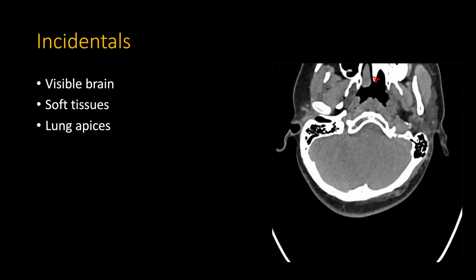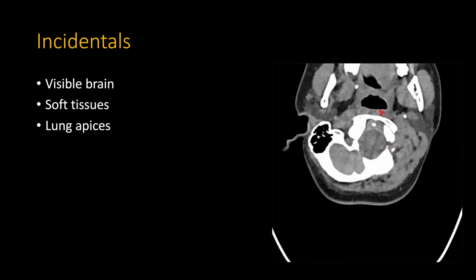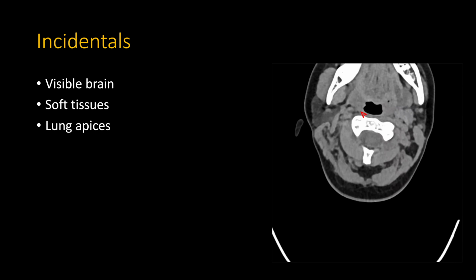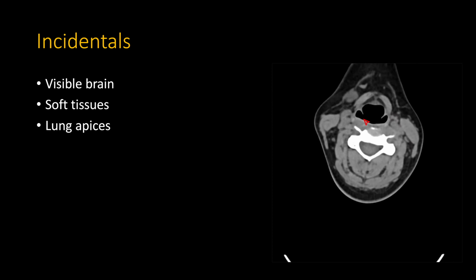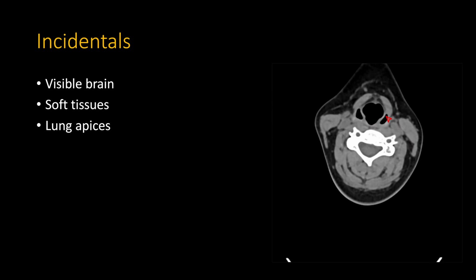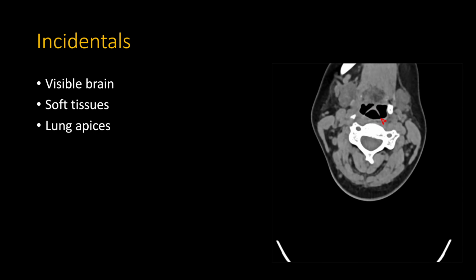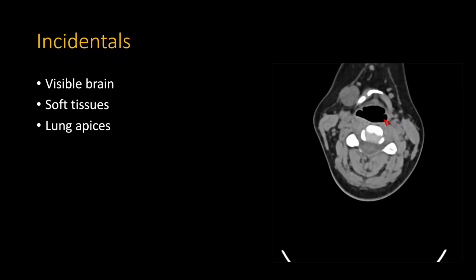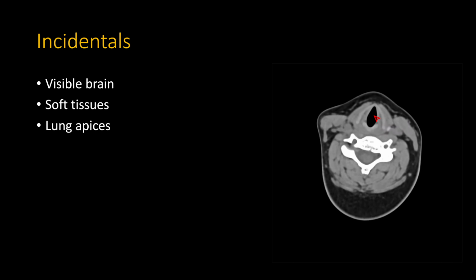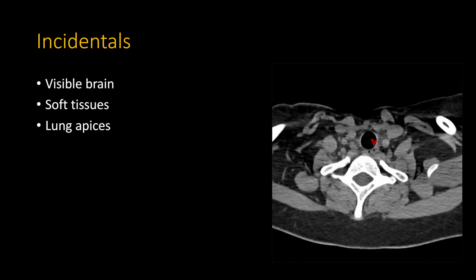Then I come back down one more time while looking at the pharynx and larynx. So you start up here at your nasopharynx, make sure there's no asymmetry or mass, come down your oropharynx, and then you come down. You're going to have your supraglottic larynx, your hypopharynx here. Make sure there's no asymmetry, no asymmetric effacement of any of those recesses, like your piriform sinuses or vallecula in the setting of the oropharynx. Here are the vallecula, here are the piriform sinuses. Then you look at the larynx, make sure again, no effacement, no mass, etc.